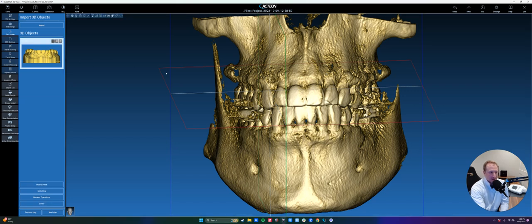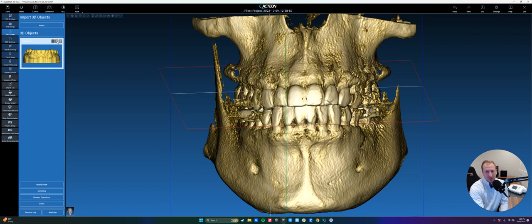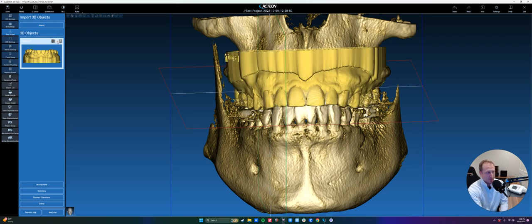You can also do the same exact options if you're in the data import panel. You can go back to it at any point during your working with the case. We can left click on the little toolbar options there, and it has the same options here for each panel. They also have this little eyeball that toggles on the ability to view it or not.